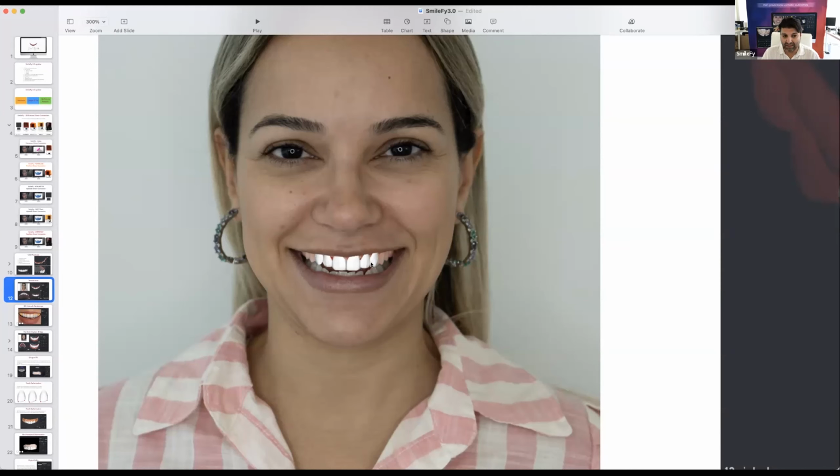We also have the Vita colors integrated here, so you can select M1, M2, B1, C2, whatever it is, add it on top of the ceramics, composite material, or whatever it is, and then visualize the smile in this way. I think that's really powerful, and we can create something that looks more natural.